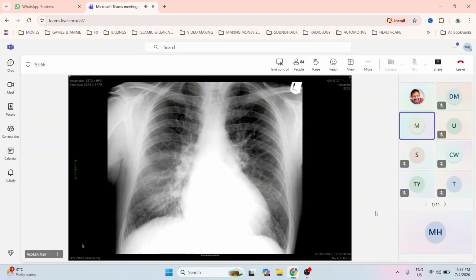So this may represent cardiomegaly with pulmonary edema. I would like to do an echocardiogram to confirm my finding and correlate with the patient's presentation. Okay, fine. So this is right. This is a case of pulmonary edema, but it's early pulmonary edema, more interstitial stage. Good, you recognize the Kerley B lines. For exam purposes, when you see Kerley B lines, two things you think of. If the heart is big, it's heart failure. If the heart is not big, what do you think of?